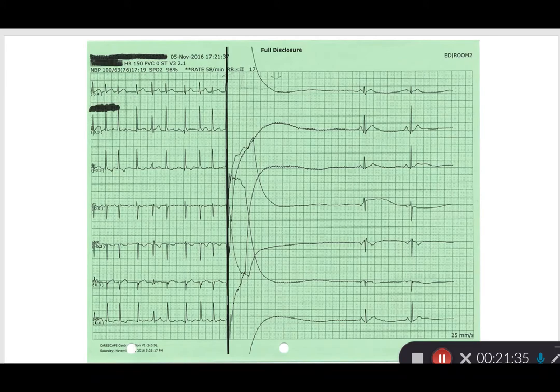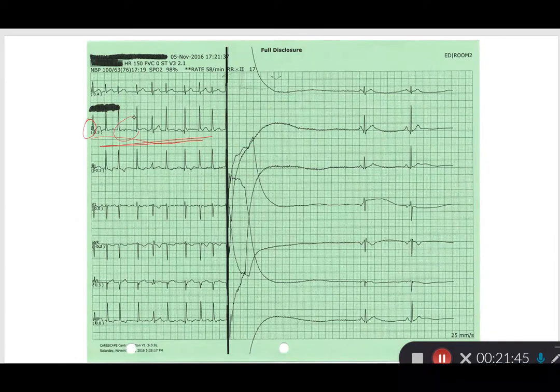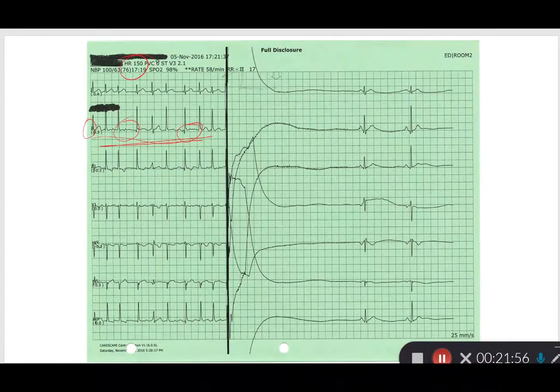All right, this is another AFib. So if we look at lead 2, which is right here, we won't pick apart this rhythm too much. We can see that we have our fib waves in between our QRS complexes. Our QRSs are narrow. Here's another good place where we can see our fib waves. And this heart rate was 150 beats per minute, which is an average because we know it's a little bit irregular. And we have narrow complexes. So this person was in AFib with RVR.